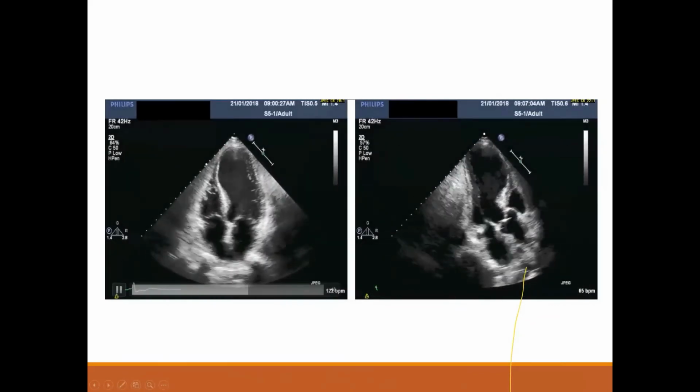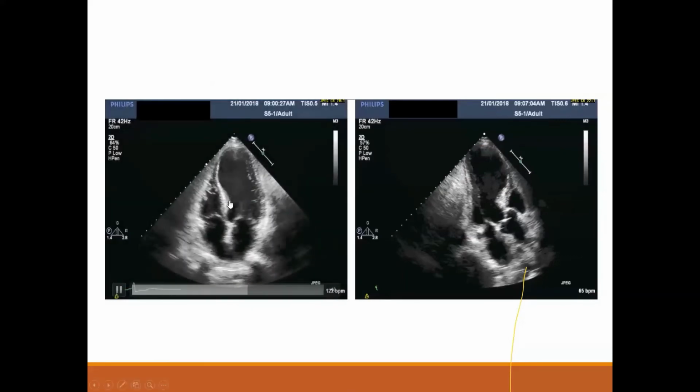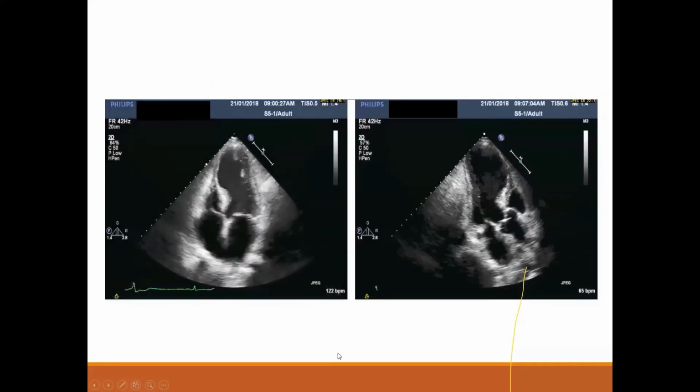Now, if this patient came to the hospital, apical and mid septal hypertrophy, lateral and septal wall hypertrophy, here, you mean here? In the basal septum, that might not be hypertrophy, but rather hyperdynamic or compensatory hyperkinesis, because this is the only contracting part, so it's trying to compensate. Yeah. Okay.